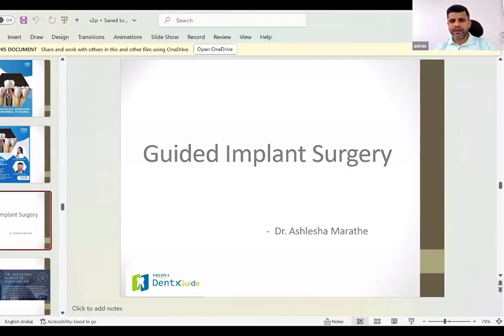Yes. So it depends upon how porotic the jaw is. In such cases, we need to see where the nerve is entering and where the nerve is exiting. So we start from there, right? Generally, we start from here and go anteriorly and mark the nerve canal.